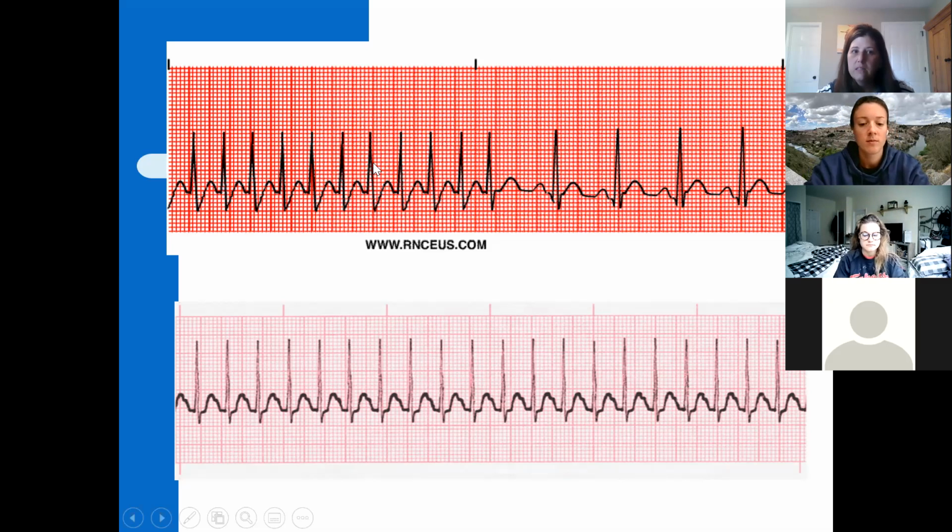The depolarization is the QRS, and because this is normal, I have to have this repolarization in the T wave. QRS is normal, I have to let it repolarize, rest, recover, refill. QRS is normal, T wave, rest, recover, refill. All this is normal for the QRS and the T. It's the P's that I'm not seeing, and it is super fast.